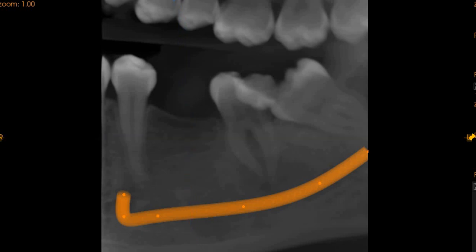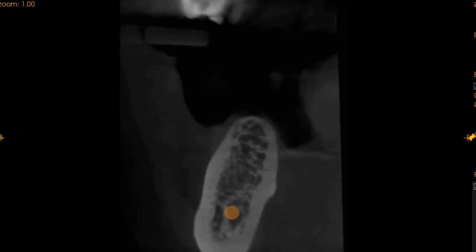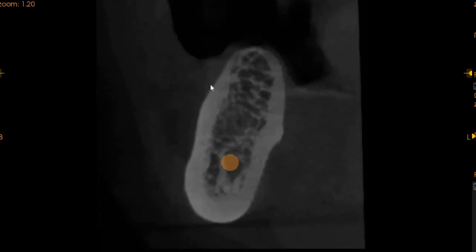So now moving to the first molar region. In the first molar region, we've got very good quality D2 level bone. We've got good cortical plates. We've got a very healthy cancellous bone. And if we can measure the ridge for our kind doctor, approximately 6 of ridge width, and we've got a very good approximate length of 14 from the crest of the ridge to the inferior alveolar nerve.